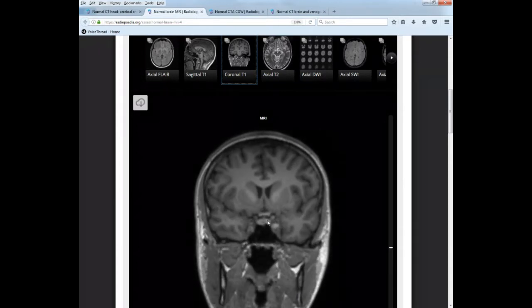Just below that, pituitary. This is the pituitary gland. The stalk that travels, it's not connecting to the optic chiasma. It looks like it is. It's actually traveling posterior to that, back to the hypothalamus, is the infundibulum right there. Okay, so pituitary, infundibulum, not connected to the optic chiasma, although it looks like it, and that's your optic chiasma.